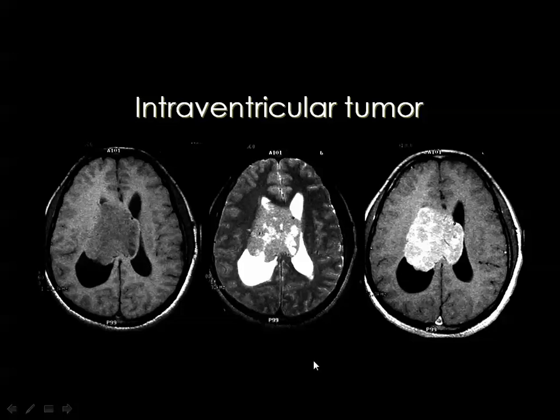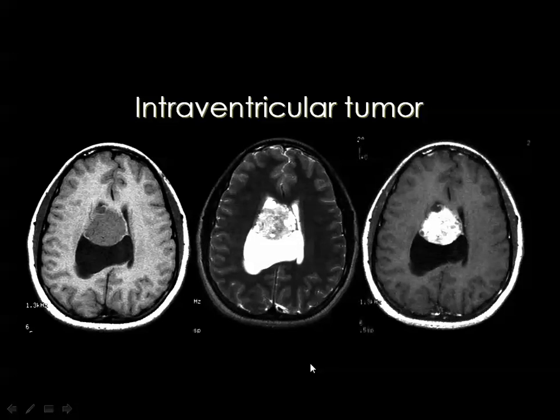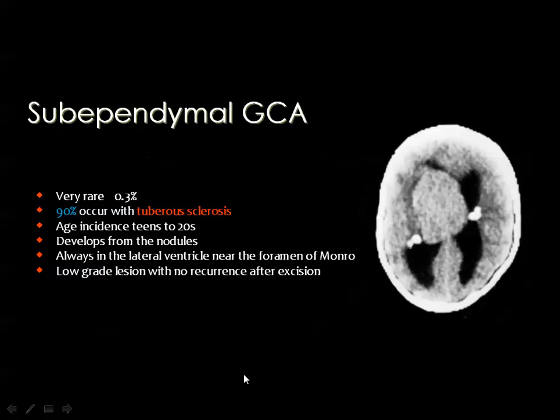And you know that ependymoma in adults will occur in the supratentorial area, while in the pediatric age group it is frequently seen in the region of the fourth ventricle. And this is a similar case, and you can see a tumor inside the right lateral ventricle. The right lateral ventricle is grossly dilated, no evidence of periventricular edema around the lesion, and the lesion showed a strong, almost homogeneous post-contrast enhancement. Then the diagnosis here is just an intraventricular tumor, which may be an ependymoma or a choroid plexus papilloma.